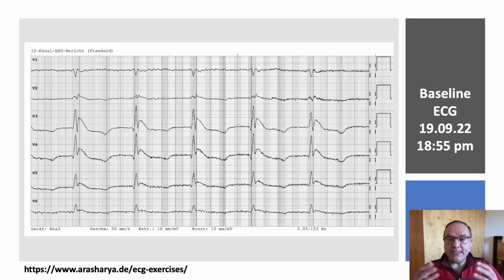At the beginning, we see sinus tachycardia, which is part of the general stress reaction. As the core body temperature decreases below 35 degrees centigrade, we see some additional ECG findings like sinus bradycardia, sinus arrest, junctional escape rhythm, PR interval prolongation, QT interval prolongation, and QRS duration prolongation. And finally, as the body temperature drops below 25 degrees centigrade, we will see some additional ectopic activity, and finally, atrial fibrillation, ventricular fibrillation, and asystole.